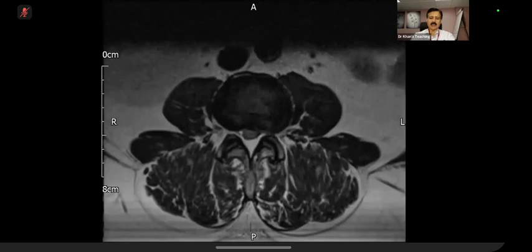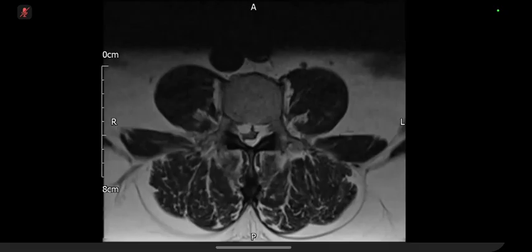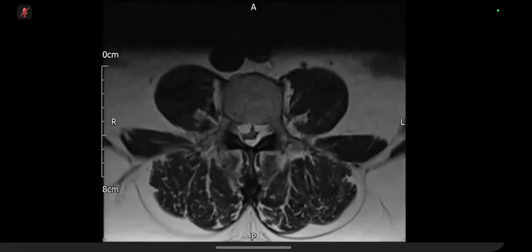Okay, let's have a discussion. I'll take over the mouse. Now you have seen everything. What do you think is happening? Why is this thecal sac compressed? They've got an adrenal lesion on CT, and then they've got clumping. So the roots are all clumped together and then being pulled anteriorly. So I'm concerned that there's an arachnoiditis or just deposits that are causing that pathology.